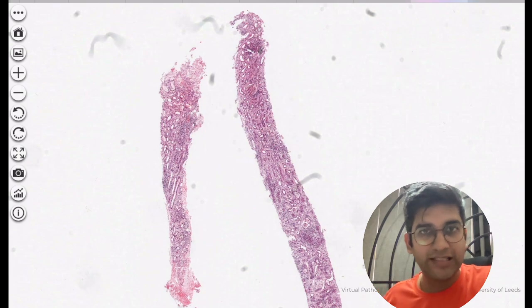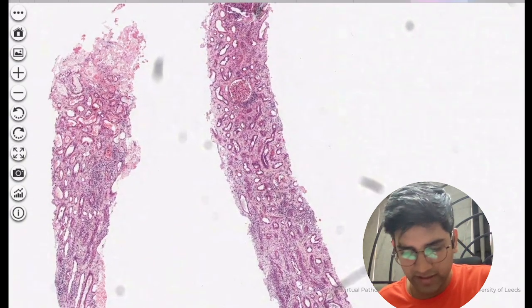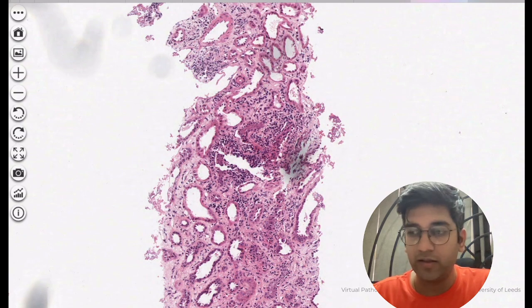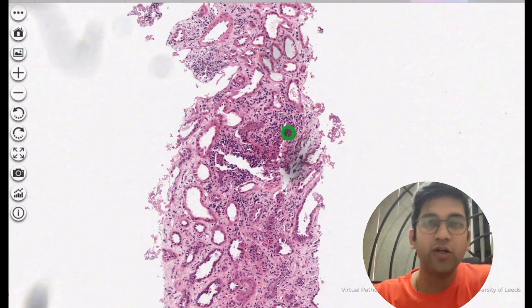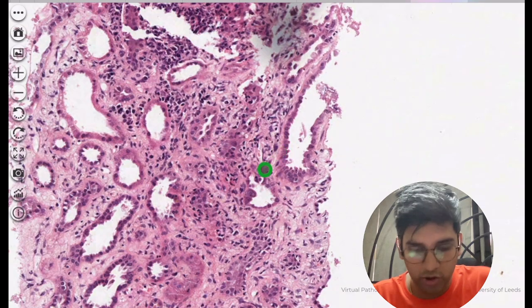So now you can see two core biopsies. Definitely, it's including a little bit of medulla, not much, right? It is predominantly the cortical areas, right? Now, if you're suspecting polyomavirus nephropathy, or if there's a clinical suspicion of polyomavirus nephropathy, first thing is look at the areas like this where you have a good amount of concentrated, falling out nuclei and lots of interstitial inflammation. That's a place where you can easily suspect a patient with polyomavirus nephropathy, right?